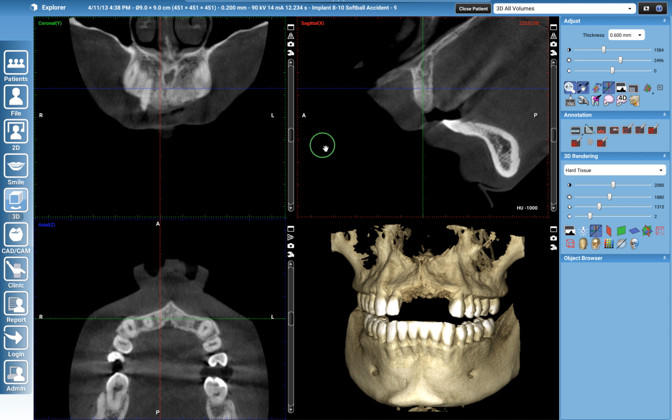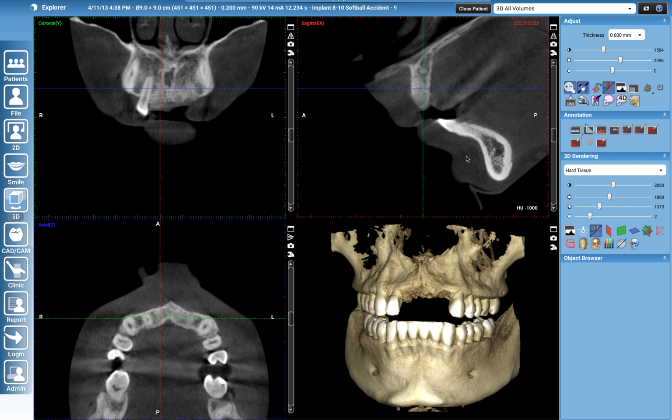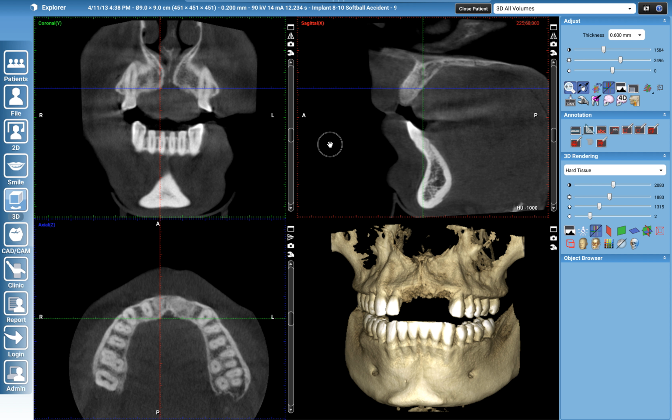But it's just important to play around a little bit in this green Explorer screen until you feel comfortable with understanding what the 3 lines do and mean. But again, I'm not going to be doing most of my planning in this screen anyway. So I'm going to go from Explorer to Implants. My 2D panoramic doesn't look so great. So I'm going to come over to my panoramic button, my auto fit.